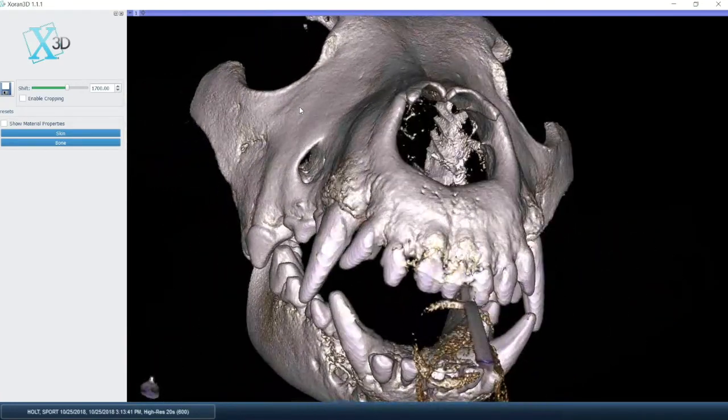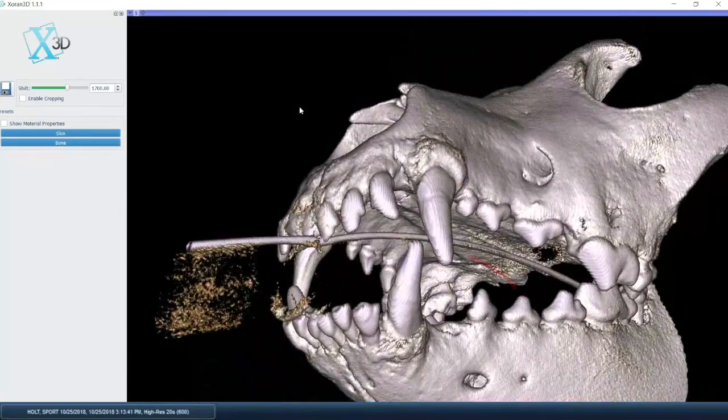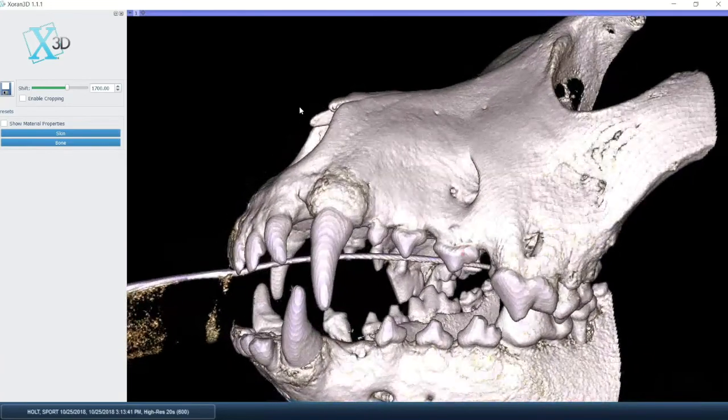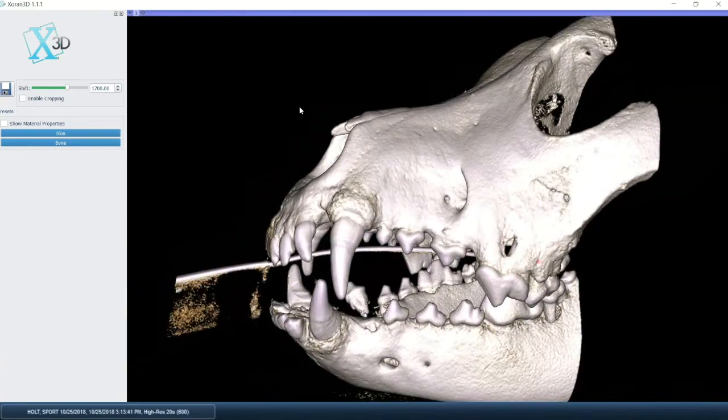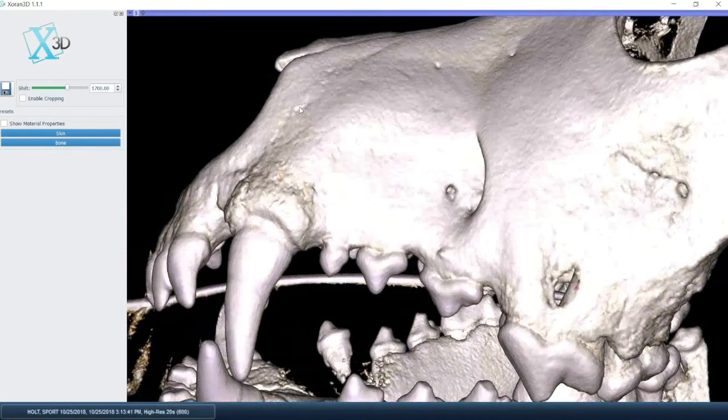The bone level is actually sort of not equal across, of course, as expected. We can see that there are areas where the bone level appears to be quite normal in spite of significant bone loss in other areas. And now we see unique areas such as this spot here, for instance, where there is bone loss that causes a fenestration. It appears that there is buccal bone at a normal bone level, and yet we have this significant fenestration that seems to be a through and through. You can actually see right through it all the way to the other side.